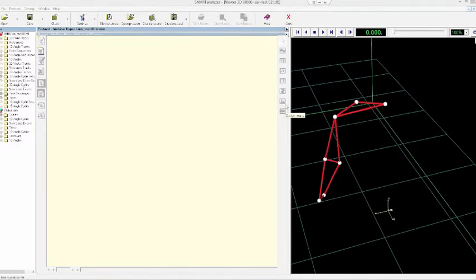The first step to create a new report is to create a blank page. To create a blank page, we have to click on this button, New Blank Page. Okay, so that's it. Usually the first page of a report contains a header with a title or a logo, for example, and then the subject information, and so on. So let me start by adding a logo, for example.